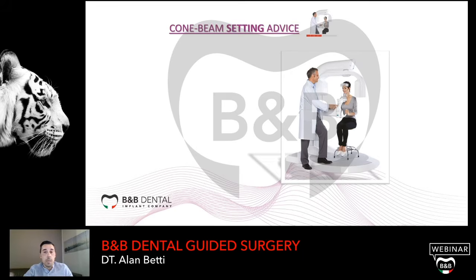This is some setting advice for doctors that have a CBCT in their dental studio. DICOM standard is the first setting. Slice from 0.3 to 0.6 millimeter is a medium resolution, which is a good resolution.